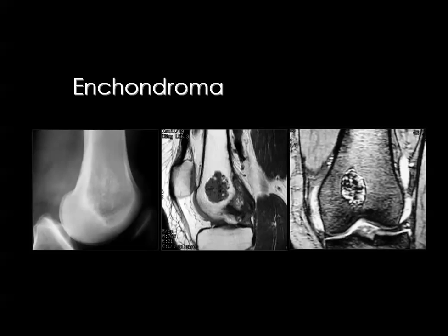And finally, as I see frequently in the reports, it may recommend the lesion to be biopsied either by CT guided or by surgical biopsy. I want to say that this lesion is an incidental finding in many cases and is not responsible for the patient's complaint. Then you may mention this lesion and say this is an enchondroma, which is an incidental finding, and look for the rest of the knee.